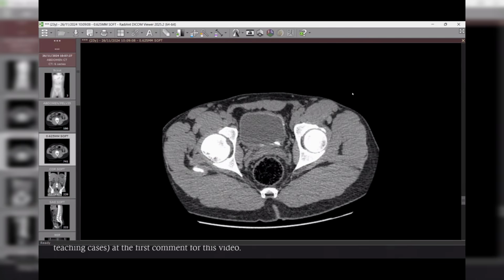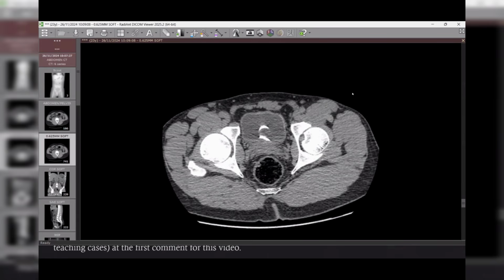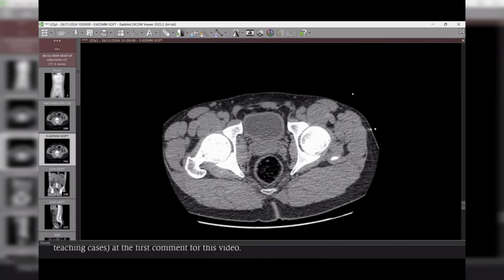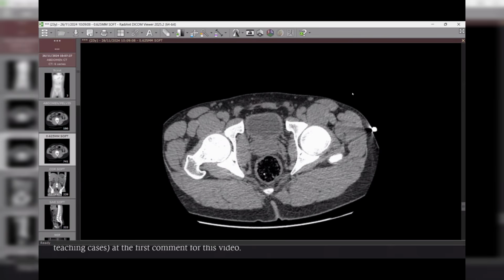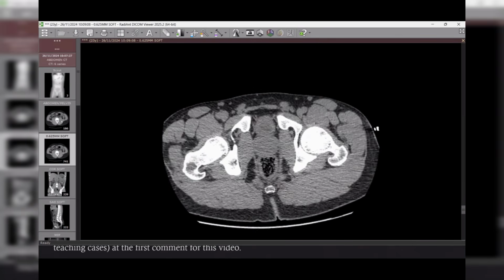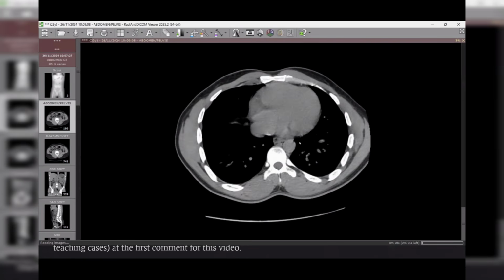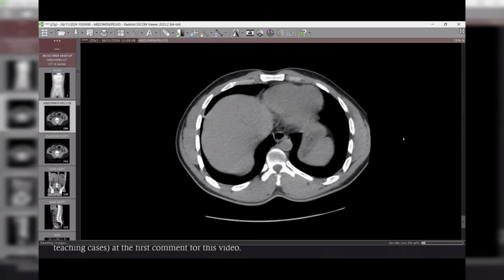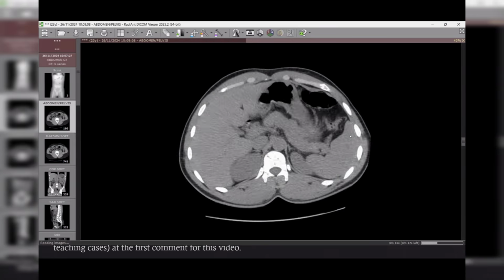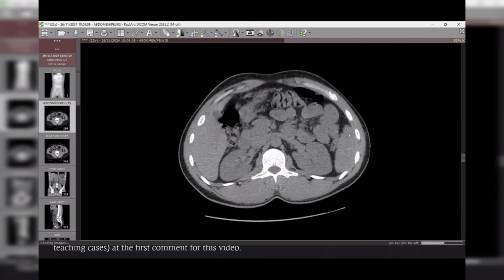So I can see that there is calcification around the thin hyperdensity along the wall of the urinary bladder. Yes. Can I give you another series? Just a minute to upload the image. Okay, this is the stent as you described.